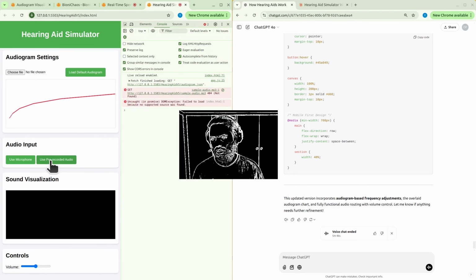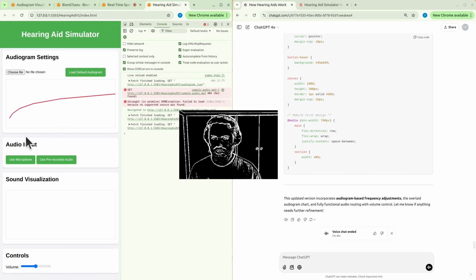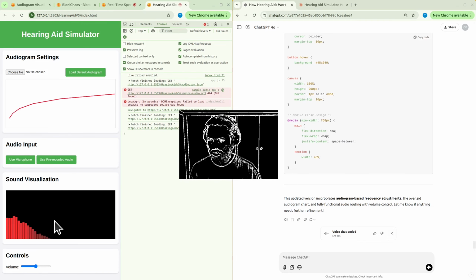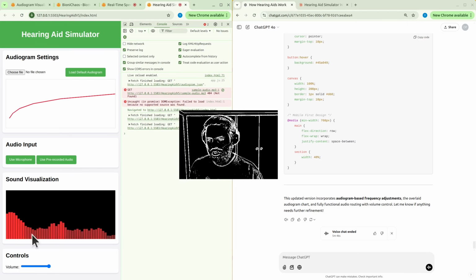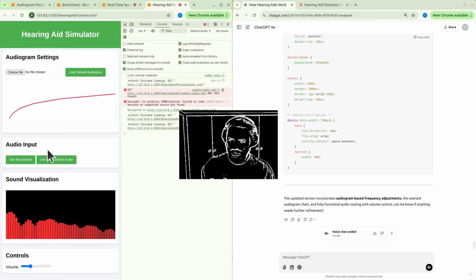It's been loaded. Yeah, there are no pre-recorded files at the moment. This should increase the volume and it doesn't actually do it. That audiogram doesn't look right. Using our own microphone, this volume is meant to increase the frequencies based on the audiogram that we cannot hear. So yeah, that's actually working. It's doing something useful. So this will be hearing aid version 5.